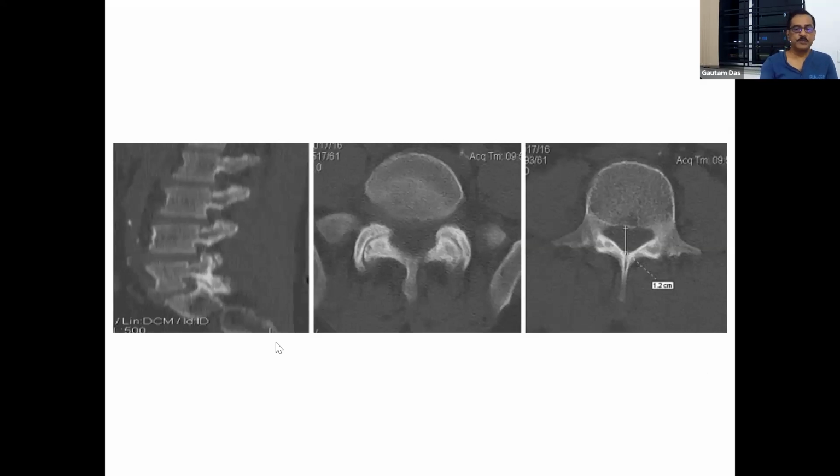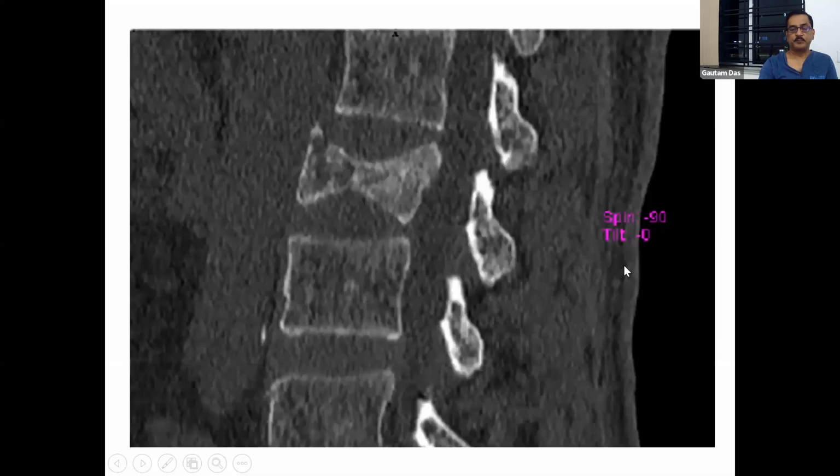Okay, so here you see this is the CT scan. So the vertebral body is like an X-ray, but your structures are much more visible. It is through which part? It is the disc. Why? Because it is not as wide as this facet joint. So this is the facet joint. This is your superior articular process. This is your inferior articular process. This is your lamina. This is your spinous process, and this is through the disc part. And you can see the bony canal diameter also by this CT scan.